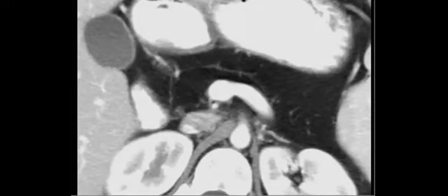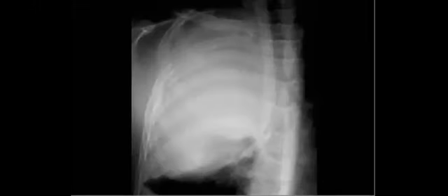One of the big entities in pediatrics. Sometimes they like to show you something like this, not very common, but maybe to put a differential. So try to put a differential then. The question will be, is it pulmonary? Is it pleural? Is it chest wall? There is unilateral hemiopacification of the thorax and overcrowding of the overlying ribs. So what will you choose? Pulmonary, pleural or chest wall?